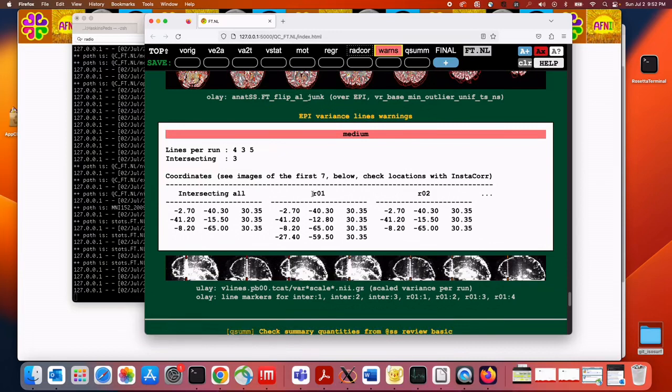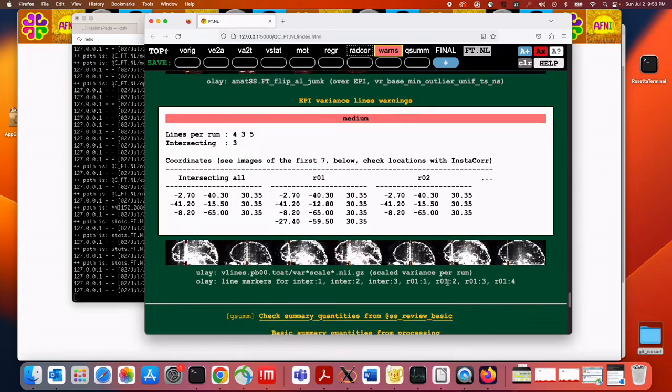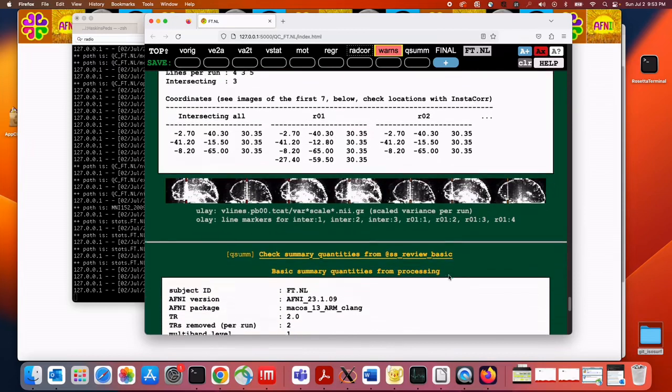And these are more or less difficult to find, and sometimes there's so many of them they really can dominate the signal through much of the brain, and so the SNR will be very low along these lines. This is a great way to see them, and you'll want to go and look at these particular locations in AFNI.